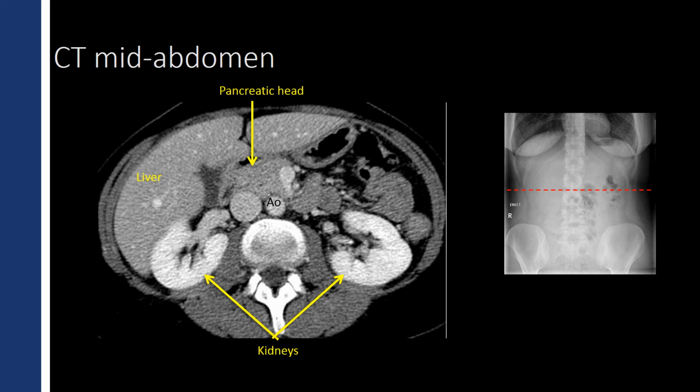And in the inferior portion of the abdomen, the aorta will move more toward the midline, but still to the right of the aorta is the inferior vena cava. We see here on this slice the renal vein, which if we would scroll up and down, we could see draining right into the inferior vena cava. We see the duodenum, which will go on to wrap around the head of the pancreas. And in this case, we're seeing a little bit of colon as well.